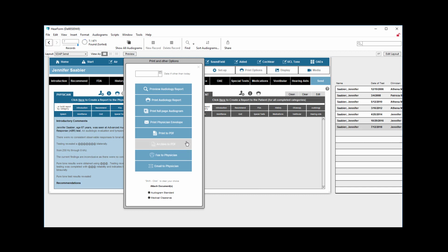You may have seen that same button on the home screen if you're showing the audiometric panel. We can fax that to the physician using eFax, MyFax, MetroFax. I think we've discussed that in another video, but you have to have some kind of a faxing system set up. I use MyFax, and just by clicking that button, it will send it to the fax machine of the designated physician without having to dial a phone number. It's about $10 a month from different companies who do that.